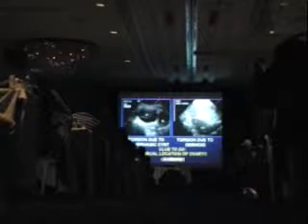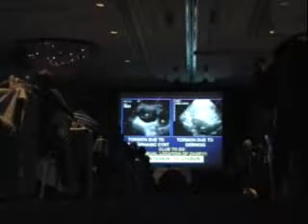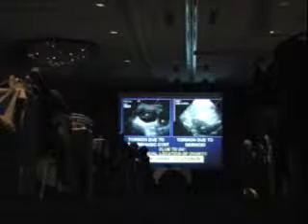Now, what is peculiar about this? The location. How often do you see an ovary sitting in front of the uterus? The ovary belongs to the side. Just like in a man who torses his testicle, you look for asymmetry in position. The same thing is true in a woman, and I think that's very important.